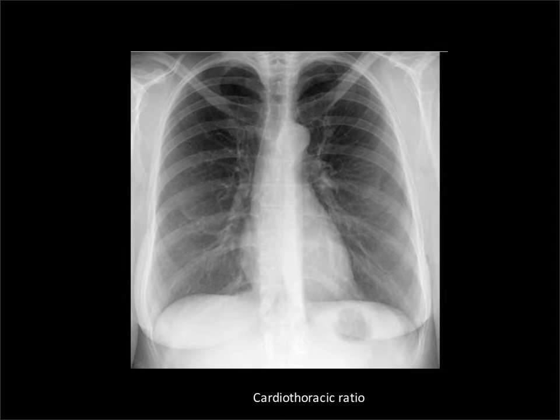All right, we've saved the heart till last. So let's talk about the cardiothoracic ratio, because a lot of people measure it incorrectly. So the cardiac, the numerator, you measure from here, excluding any epicardial fat pads, to here. That is your cardiac ratio.